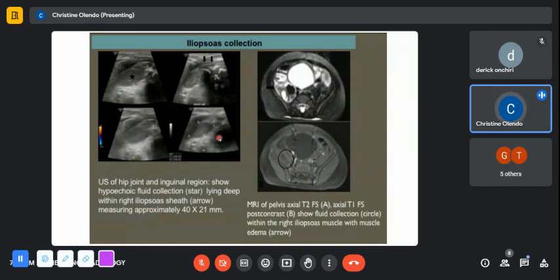A follow-up MRI was done as well. And here we have T2 fat suppressed images, axial fat suppressed images, and here we have T1 fat suppressed images. In the T2, you can see a circumscribed hyperintense lesion that is visible on the T2 fat suppressed. Which one is the T1? It's not the bright one, because that's T2. Oh, sorry. Yeah, here.